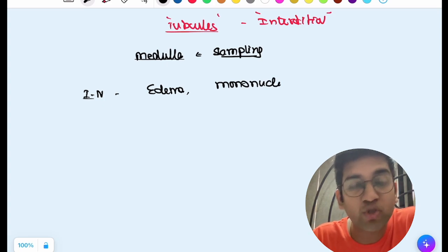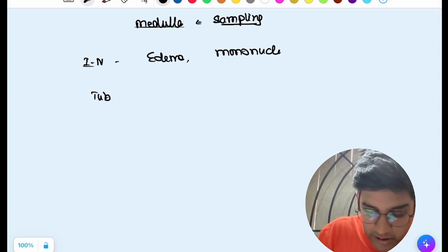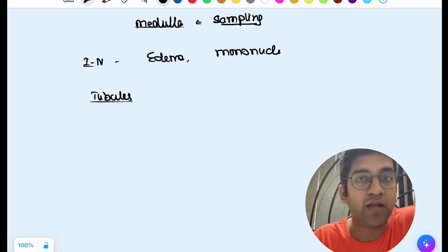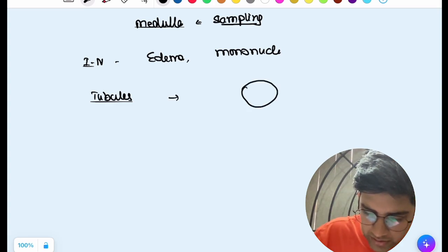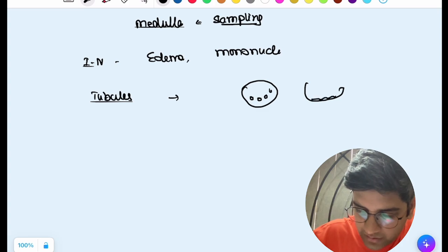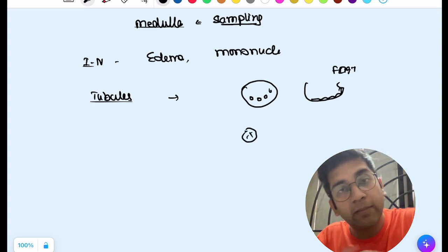The most classical finding, or the hallmark finding, is what we're going to look at in the tubules. Tubules might have extremely varied findings based on the stage of the lesion. I can have a complete dropout of the tubules, completely desquamated tubules, sloughed off, flattening, anything can be there, right? The tubules might desquamate and come outside. They may completely flatten out. They can be extremely flat, can desquamate, and completely drop out. Nothing will be there, or it will be completely necrotic, right?